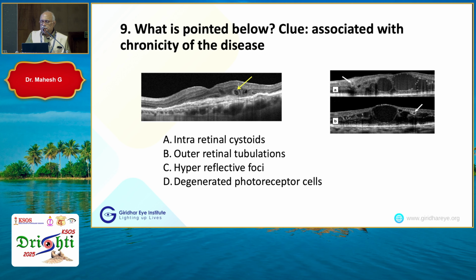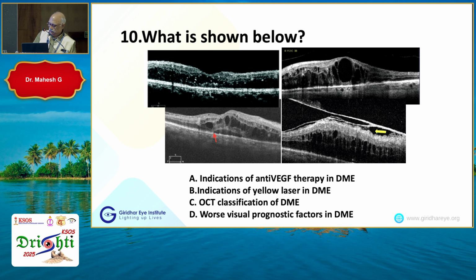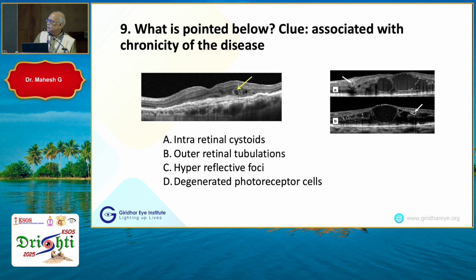What is pointed below? What is this? What is this? Sorry. What is this?